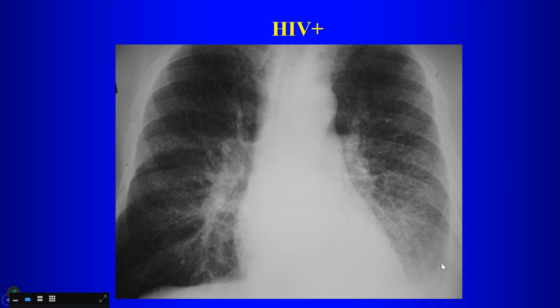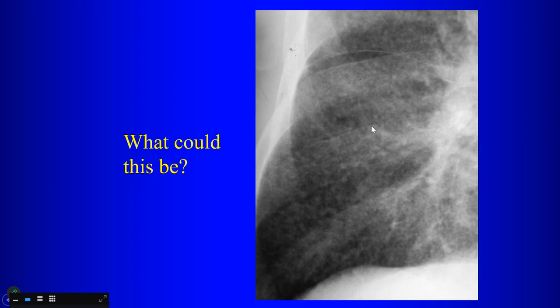Well, this represents, what are you going to call that, first of all? That's a pleural effusion, right? So there are some opacities here within the lungs. If you look very carefully at them, though, what do you notice? Yeah, they're kind of nodular, right? So you have these small nodular opacities within the lungs.